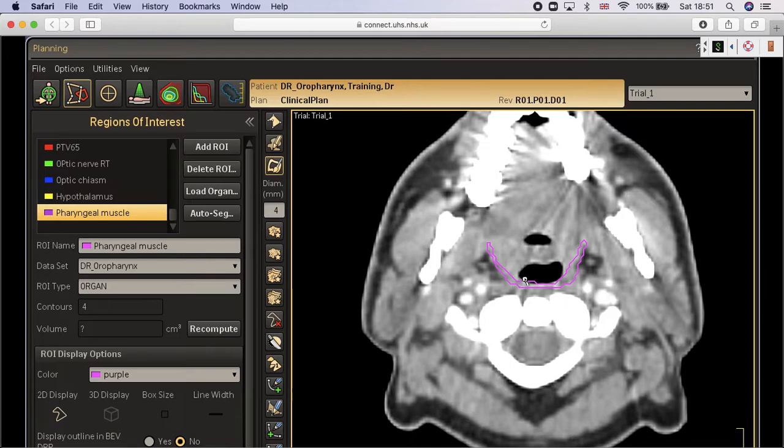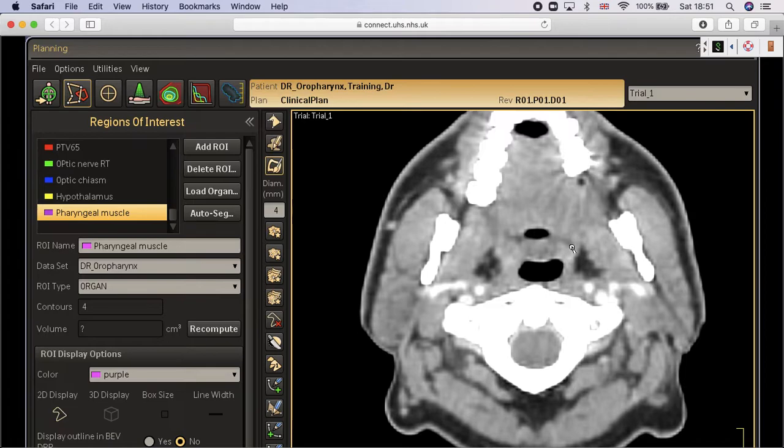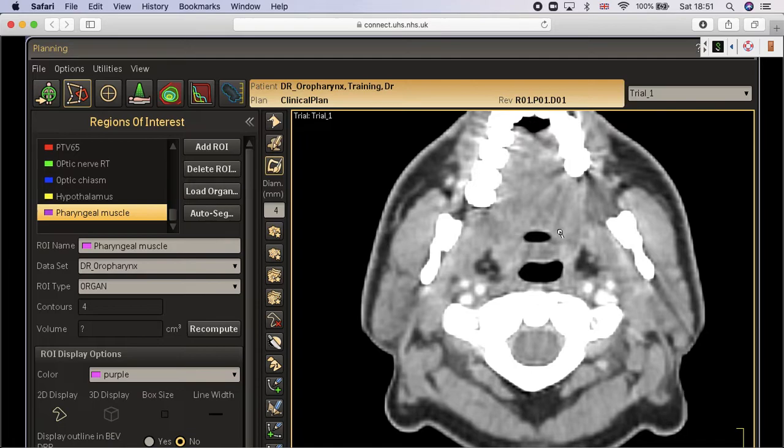So in no way do you separate the mucosa and the muscle, and it will be a V shape. And the anterior wall of the pharyngeal muscles will be nothing but the structure in front of you. What does it mean? So this is the hamulus, yeah? When you go down, you'll see that the tongue will start to appear, yeah? So it's very easy to delineate. I mean, we don't have to go to the tongue. So this is the anterior wall, so the tongue will be part of the anterior wall. And when you go down more and more, you see the hyoid bone as well. So this will be your anterior border again.